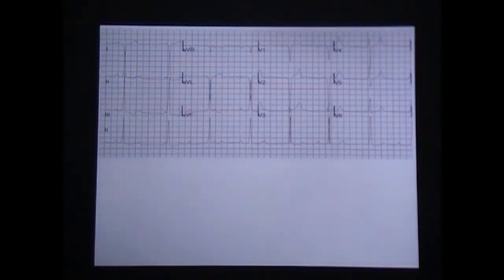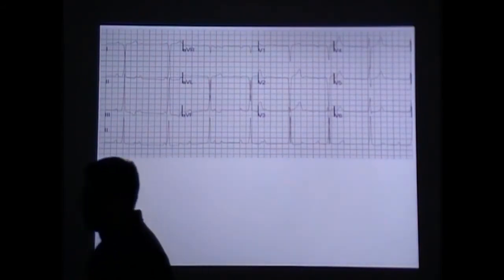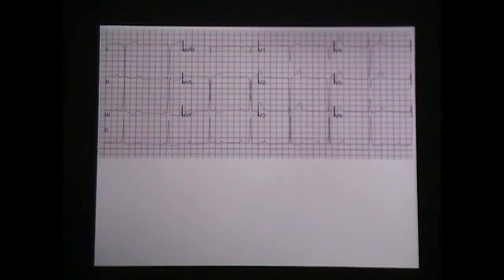Now you said the QRS. What lead do we look at for the QRS complex typically? V1 is close. So if we look at that, it's close. Do you remember the number? 0.12. Correct. So how many boxes is greater than that? 3. You can get closer if you want. Then it's pretty, yeah, it's right on that border, like 3.5. And then a downward deflection in V1 is indicative of a left bundle branch.